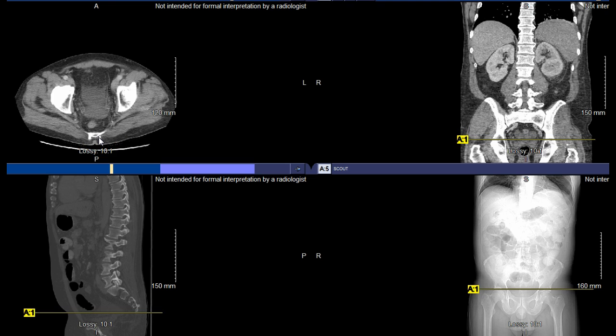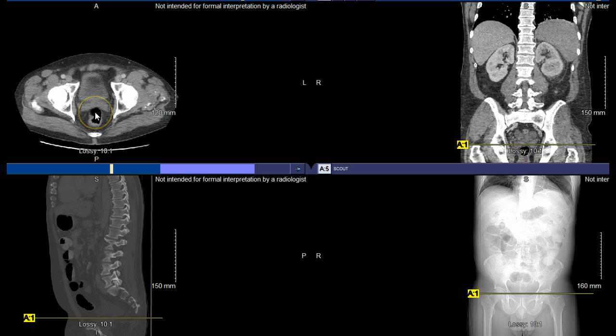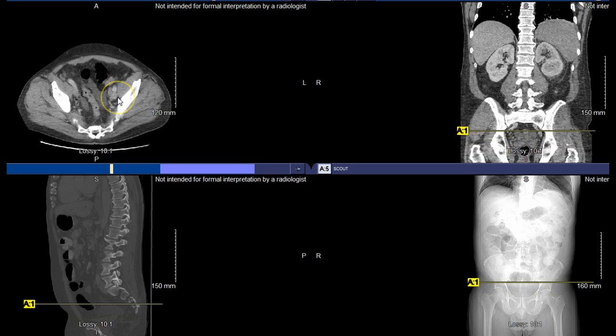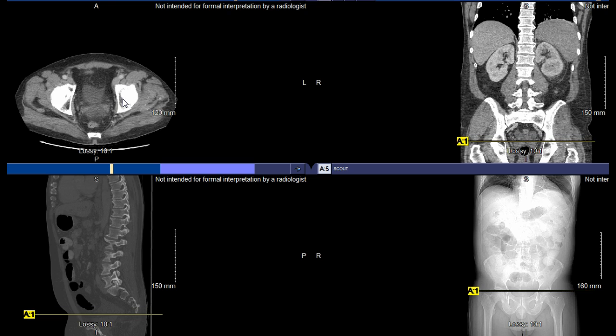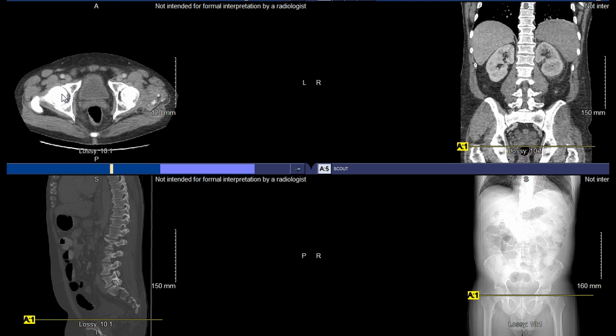Other bony structures that are present here, again, this doesn't matter male versus female. You can see right here is the roof of the acetabulum. As we continue to go down, what we'll be able to see and demonstrate, and of course, if we changed our window we could demonstrate some of the bony processes a little bit better than what we're seeing here with the abdominal pelvic window. But you can see the femoral head there.